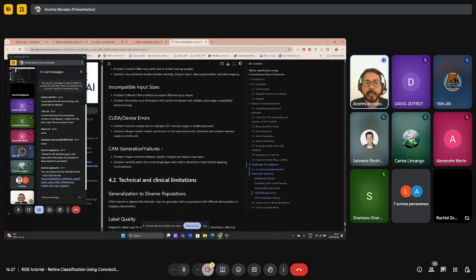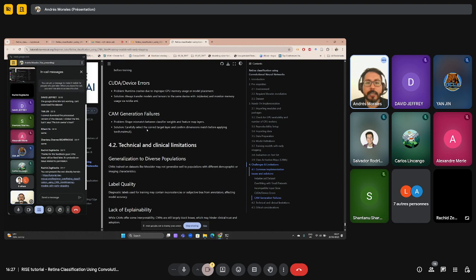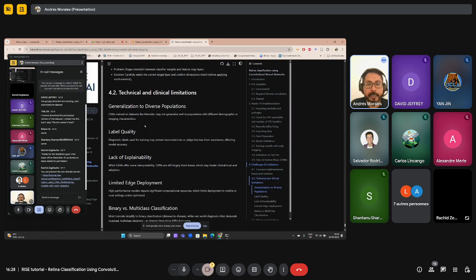So this will already check. Be careful with the CUDA errors. Try to check the one step where they have problems. And also be sure that all the networks in the counts are correct, as there can be failures. So now this is tested, but if you have another model, be sure that you check the proper layer from where you want to extract the data. Some things could fail, especially if you add more models in this case.